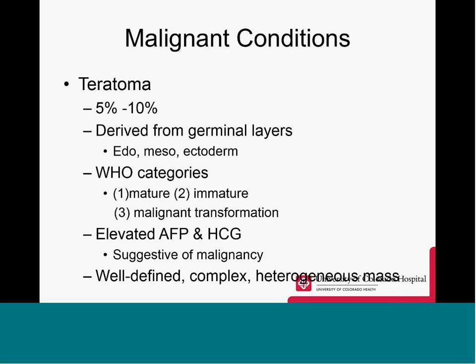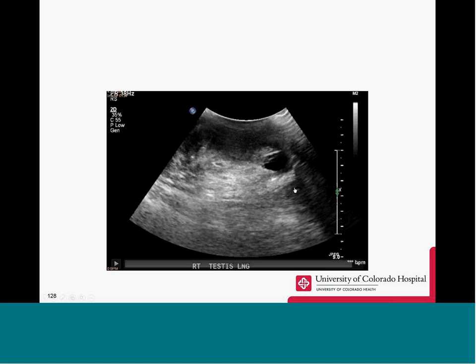On ultrasound, we're going to see a well-defined, complex, heterogeneous mass. They're often dense with echogenic foci. Another non-working cine clip, sorry.